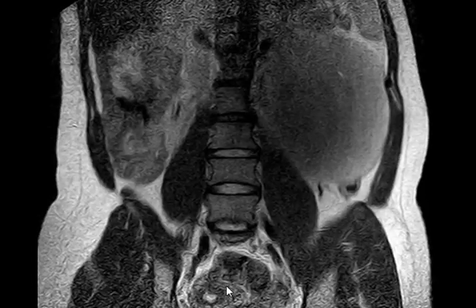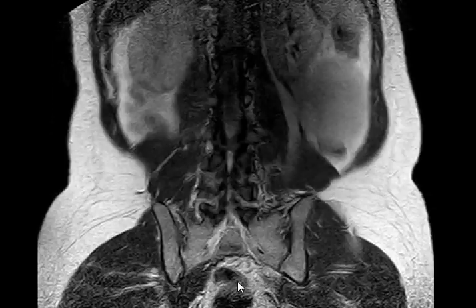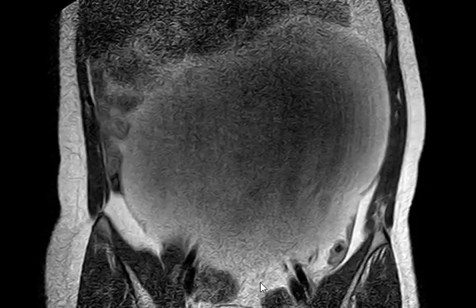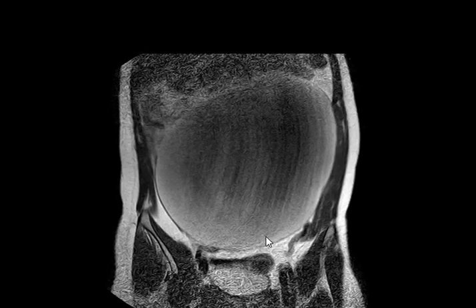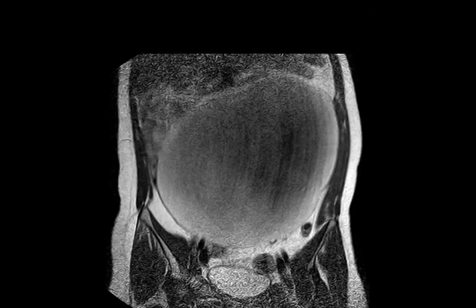Where is the pelvic mass that they are searching for, or that they saw in the ultrasound? What is this? Wait. You can just look here, and make it smaller. Yeah. Where is the mass? This is the mass. Abdominal. This is a hyperintense mass. Well-defined, well-encapsulated intra-abdominal mass.